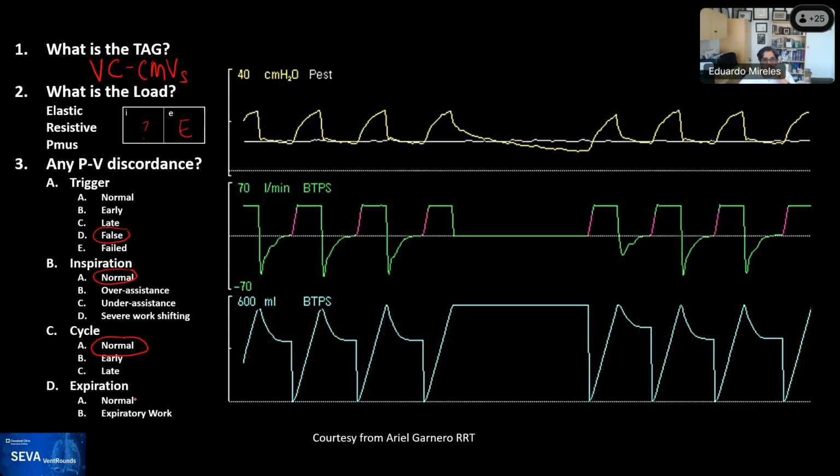And then expiration, is there any evidence of work during expiration? Yeah, well, the majority of you see it as normal. Very good. So this is a very nice example that Ariel gathered. And there's a little clue here. There's several clues that are very nice to see here.